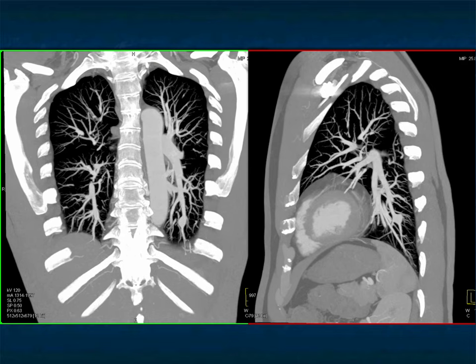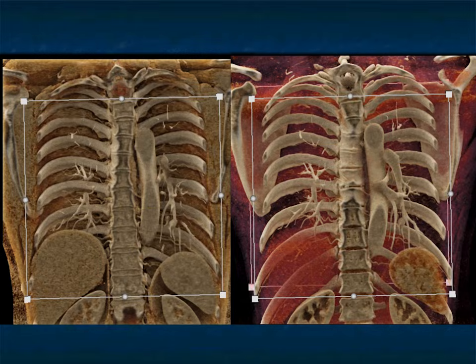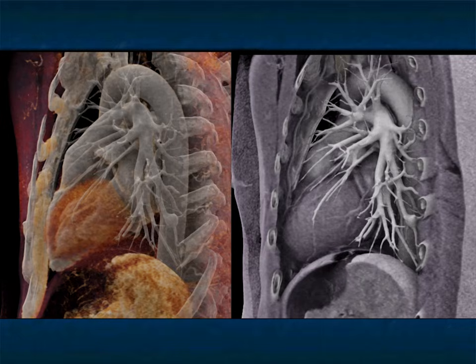And this case very nicely shows you there's only one lesion present, despite the fact that I used lots of MIP imaging, some volume rendering, and scrolled through the volume very carefully. And again, nicely shown with cinematic rendering.